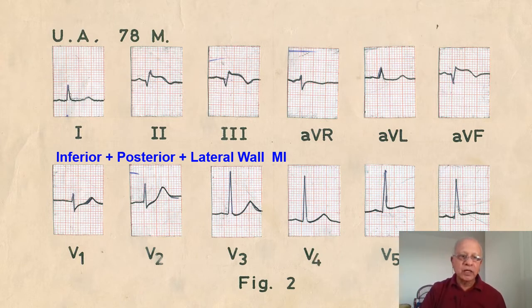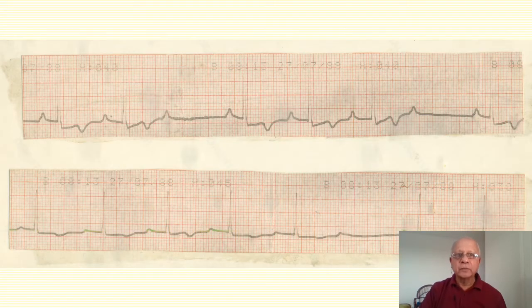So we'll go on to the next slide, which is again an arrhythmia. Now this is the ECG of a patient who came with chest pain to the emergency. Two questions are, what is the arrhythmia and what was possibly the cause of the arrhythmia?